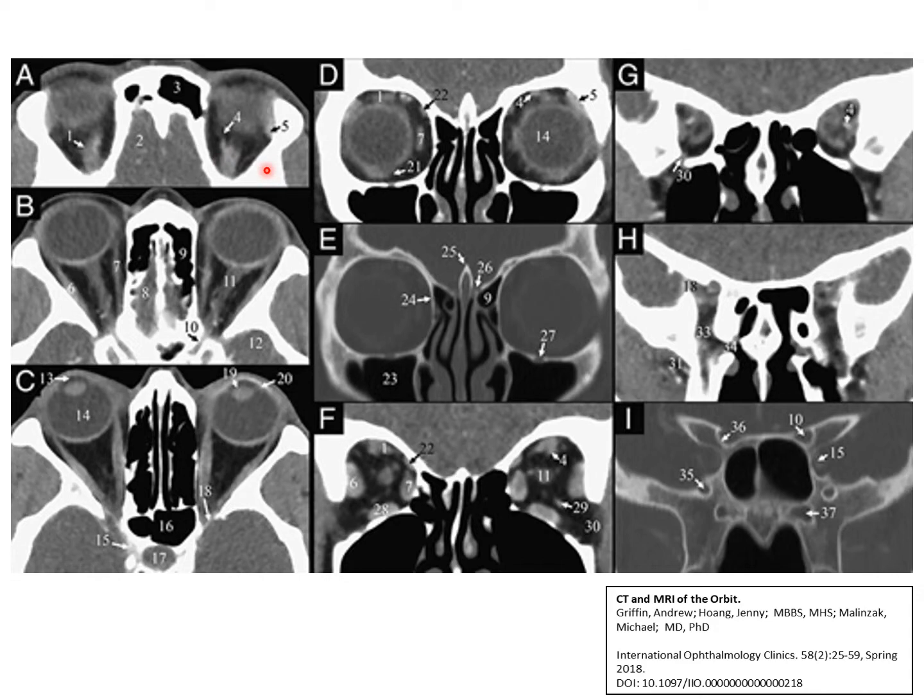which are contrast enhanced, the muscle and the superior ophthalmic vein, and here we have the lacrimal gland, which is also contrast enhanced. Now this is through the midsection of the axial section of the orbit, and we can see the two muscles. This is lateral rectus and this is medial rectus. We can see the olfactory bulb of the brain, and these are the ethmoid cells, and this is the optic nerve which is traveling in the orbit and then into the optic canal.